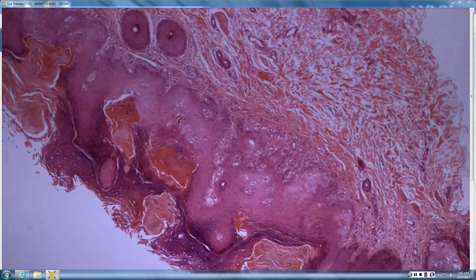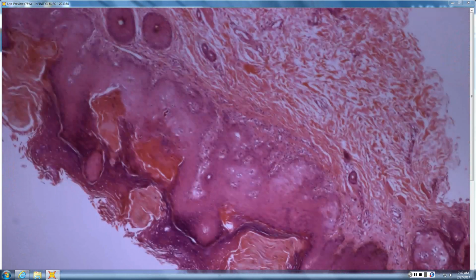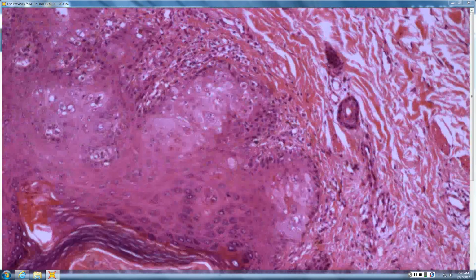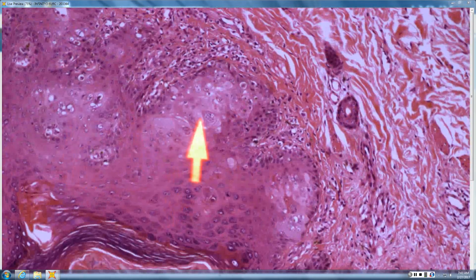Okay, David. Papillomatous epidermis, there's alternating ortho and probably some para in there. So what do you think it would have looked like clinically? With the papillomatosis, hyperkeratosis, like a seb, probably, or condyloma. Something warty. It would have been a warty lesion, warty surface. Papillomatosis, hyperkeratosis, hypergranulosis, and the cells are very large and glassy. So probably getting towards full thickness atypia, like bowenoid papulosis.